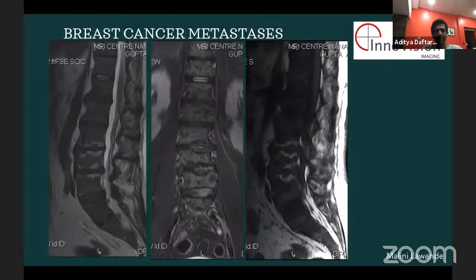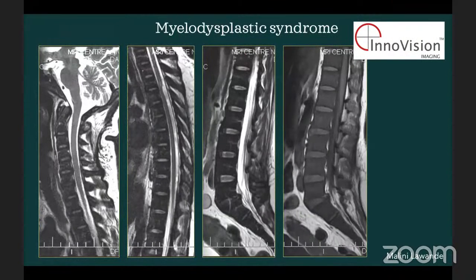Right? Now here's another example. This is your T2 weighted image. You can see that the vertebral body and the discs are almost the same intensity. On T1 also the same thing, and here on STIR. And here you can also see the same very diffuse heterogeneous signal. And this is typical when you will see diffuse metastatic disease. Yes, sir.